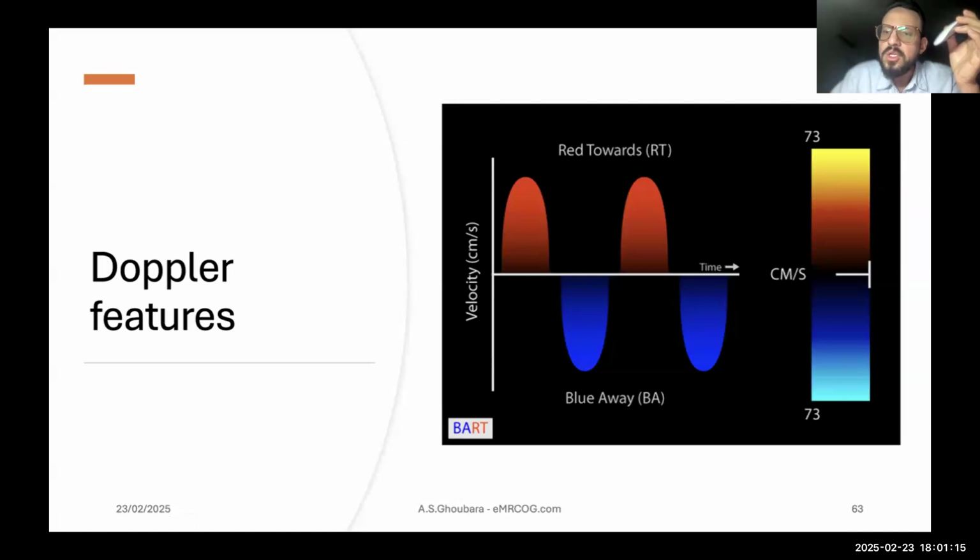So when we have a high turbulence flow, like just in case in placenta previa, placenta accreta, or cancer, or vesicular mole, which gradient of color would you expect? The one on the inner side or the bright colors? Tell me. Yes, the brighter end of the gradient.